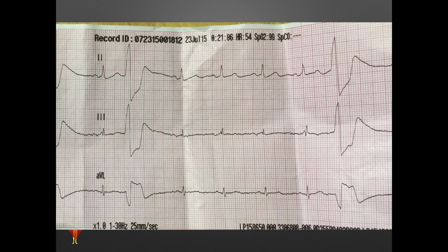Take a look at this EKG strip here. So what can we identify? Well, let's start looking at what our underlying rhythm is. We see some really ugly waves there, but let's identify those that we can, right? So if we look right in the center of the screen, we have good P waves. We have what look to be appropriate QRS complexes, right?